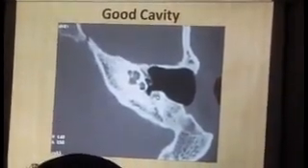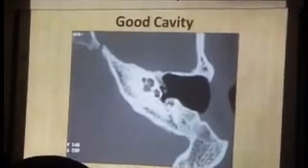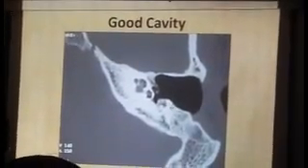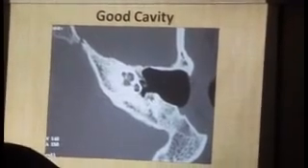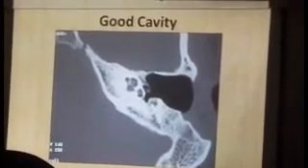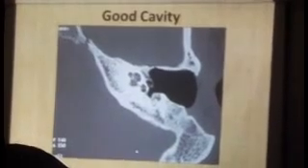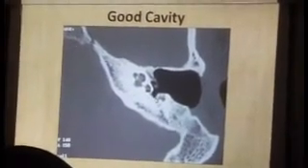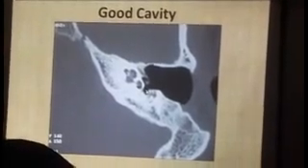Same thing. This is the facial nerve. Now look at the sinus tympani. Probably you would have been happier if you had flattened it out more, but can we? No. Unless we are doing a facial nerve decompression, or unless we intentionally want to do that. So this is your sinus tympani, and this is good disease clearance because postoperatively there is no pathology here.